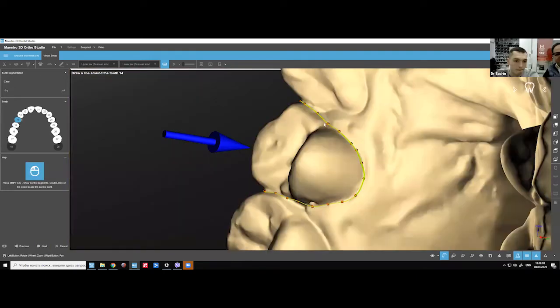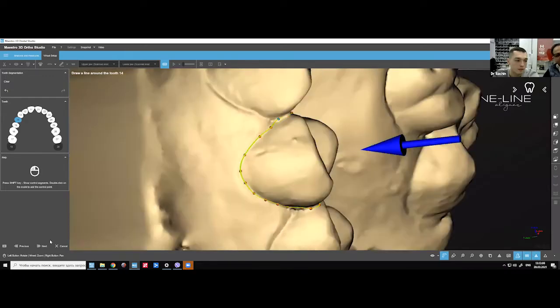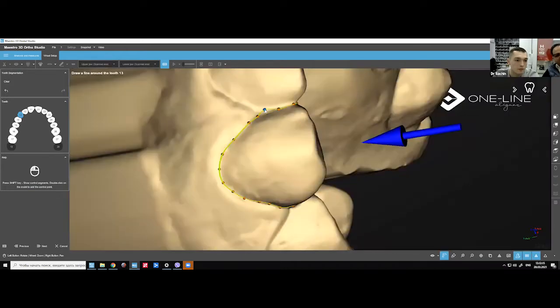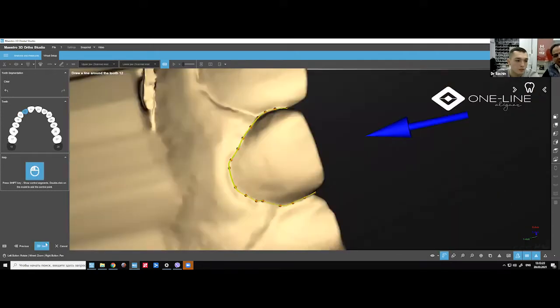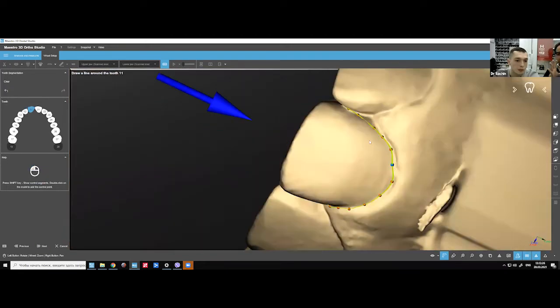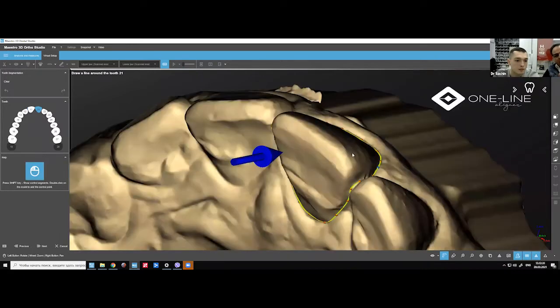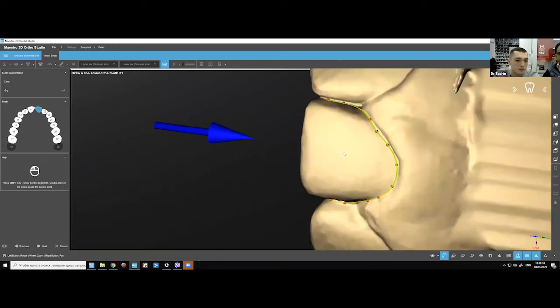Okay, so I will tell you something about this segmentation part when you actually put the line on the tooth. I had a talk with the Maestro about this. How important is it to be exact on the software to get the tooth right? If you are a few microns, like 0.1 millimeter up or down, it really doesn't matter because the force is on the tooth and the movement will take place from the part which is the green line, right? So this is good to know.